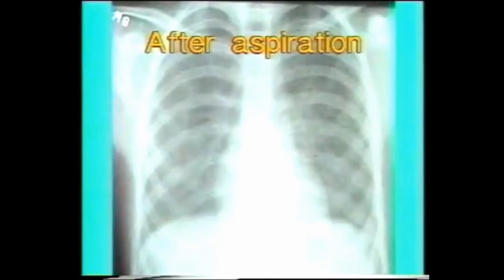Now this second X-ray shows the picture after aspiration of air. The lung has expanded and the bronchovascular markings are seen up to the chest wall. The lung does not show any lesion, infiltration or emphysematous bulla. Such spontaneous pneumothorax occurs due to a subpleural tuberculous focus.